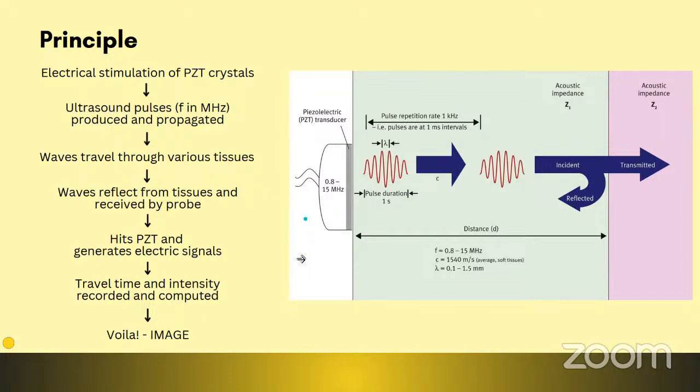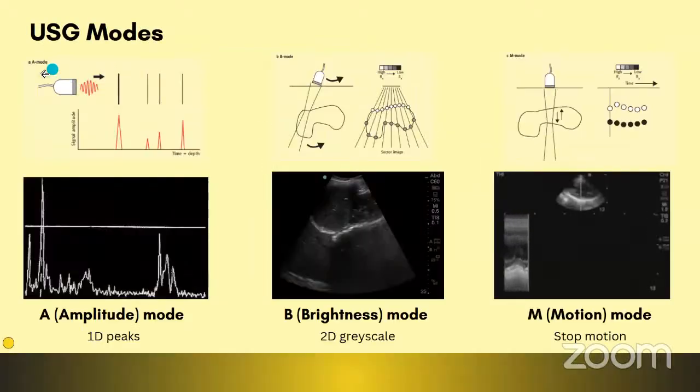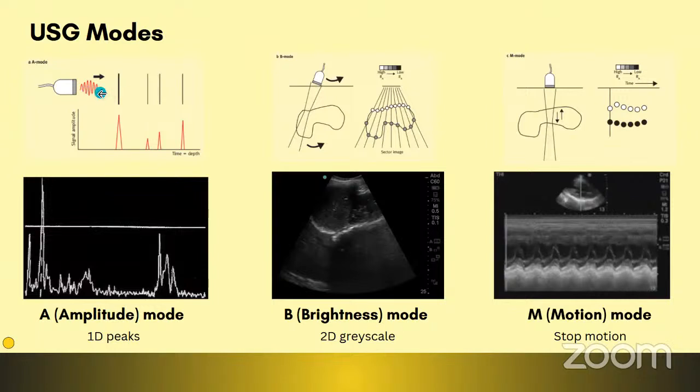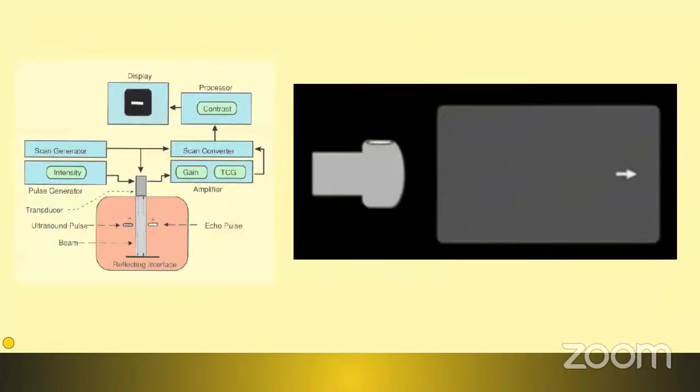You can imagine something like a magic wand. This is what we call a transducer or a probe. You can see here, right? We have an instrument which emits and also receives sound waves. This is called a transducer or a probe.